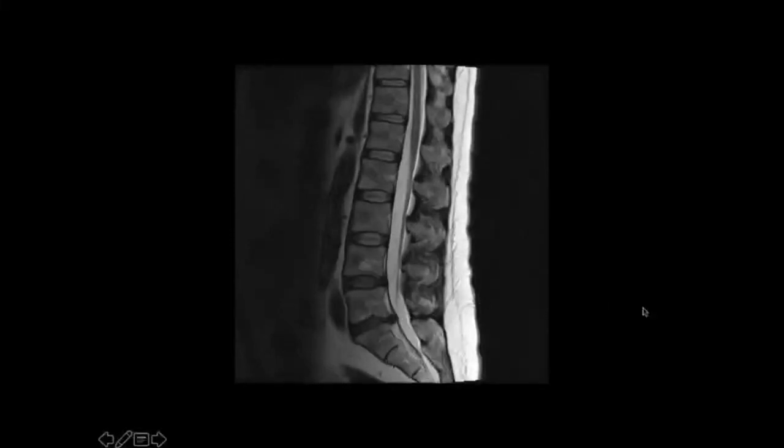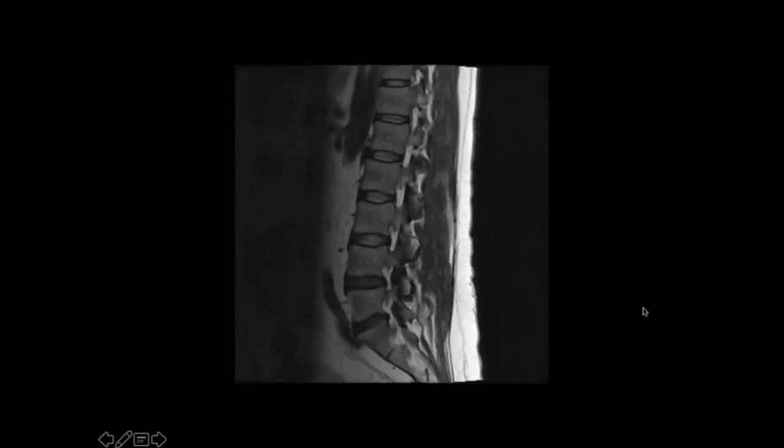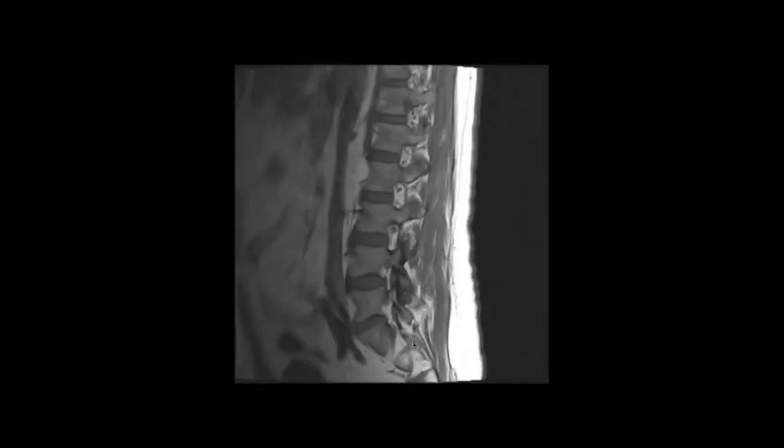Looking at the vertebral end plates, and then coming out in the more parasagittal region, you're looking at the neural foramina again, and you see that sort of a keyhole appearance. The central portion of the key, the hole or the dark bit, is the nerve coming out, and surrounding that is the epidural fat. It's not just the CSF, it's the epidural fat, because if you look at the T1 weighted image, again, you can see that this is bright. So that is again the epidural fat which you see within the neural foramina. So again, the nerve over there, the keyhole, that's the epidural fat.